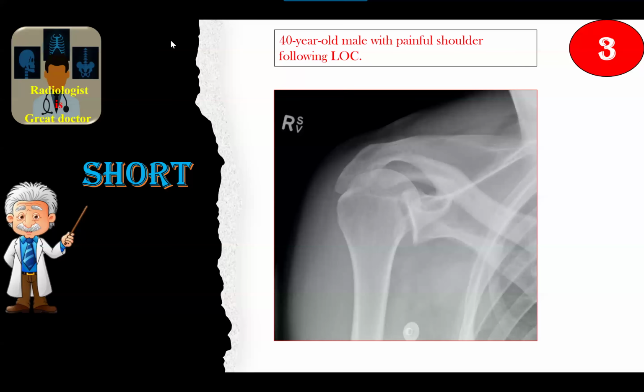Start to describe. Okay, sir. I am provided with an apical oblique view of the right shoulder, in which I can appreciate that there is posterior dislocation of the shoulder, forming the trough sign. The glenoid and the rest of the visualized bones, ribs, and visualized lung are unremarkable. So I would ask for any other view if available, and convey my findings to the referring physician and refer the patient urgently to the orthopedic surgeon. MRI may be helpful if clinically indicated, after resolution of the edema.